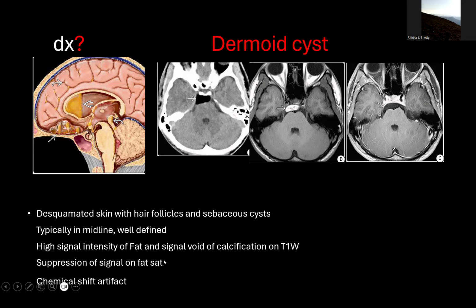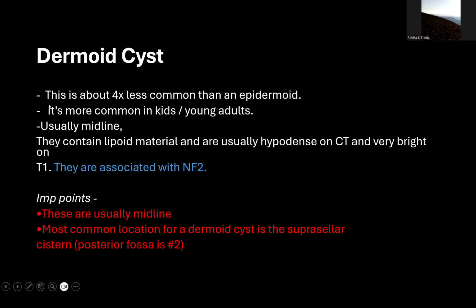confirm that it is dermoid. It will be suppressed in case of fat sat sequence. There will be chemical shift artifact.